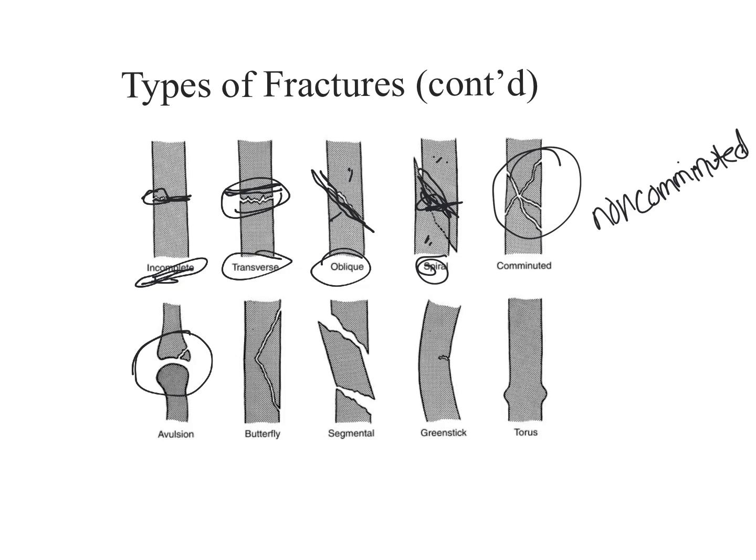This, for example, looks like a joint within a finger, and this is the end of, let's say, a metacarpal, and just the little piece, the little end there, is fractured, and that's what's specifically an avulsion. Butterfly, we can see here, the bone is technically broken into two parts again here, but we have an almost triangular shape piece coming off. Segmental, it's broken off into segments.